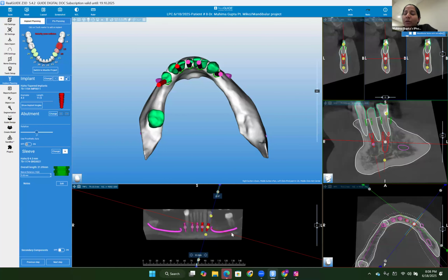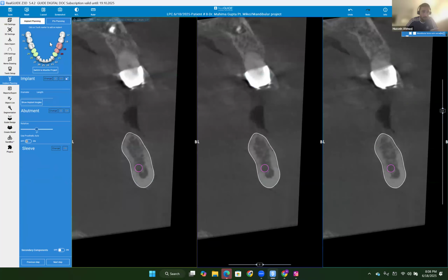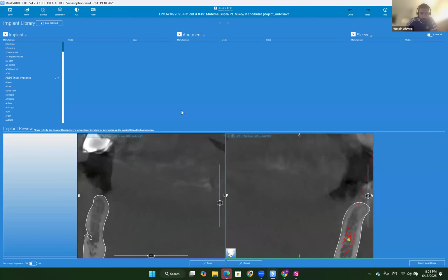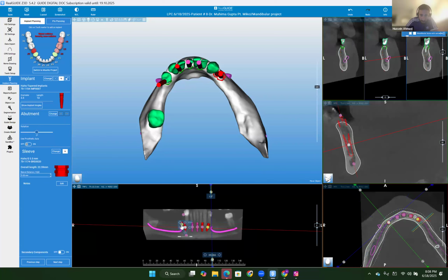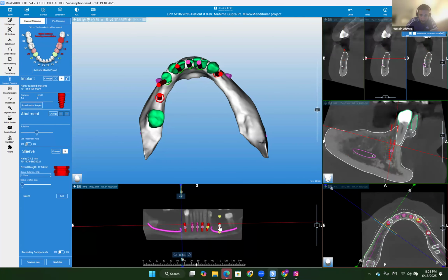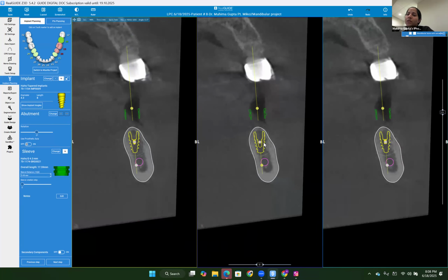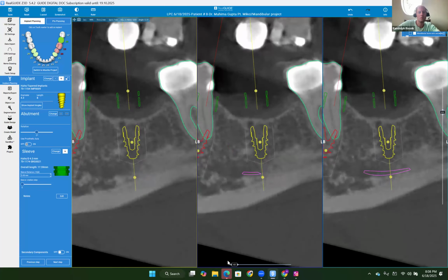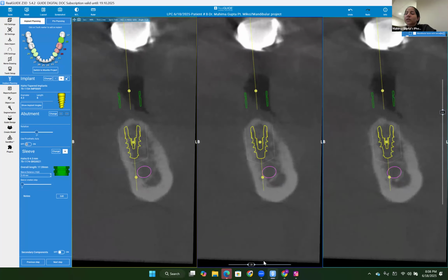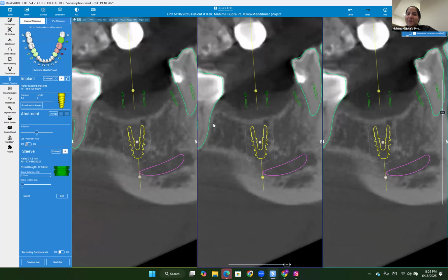I think the tooth the patient has is 18. Can we place the implant more anterior to 18? Around this point? It looked a little thin there. Here we go. Let's give a 4.3 by 8 millimeter implant shot. Somewhere over here. What's your opinion on this implant, doc? Same thing, you'd be fine there. So I can place it, but I have to do the sectional. Correct, because it's still going to be behind the foramen. Sectional FP3 on the posterior? Yes. Got it. Thank you so much. That was my biggest question. Perfect.